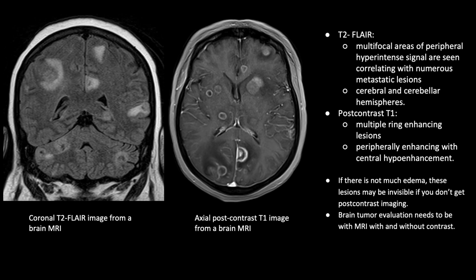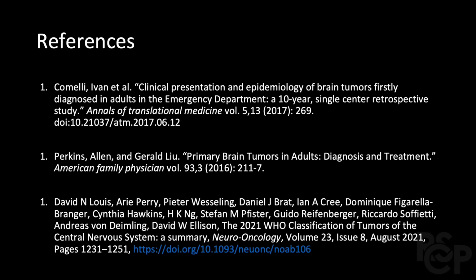On the post-contrast T1, you can see the ring-enhancing lesions, which show peripheral enhancement with that central hypo-enhancement, creating that ring-like appearance. If the metastatic lesions do not cause much edema, it can be virtually impossible to diagnose without post-contrast imaging. That's why in brain tumor evaluation, it is very important that you receive an MRI with and without contrast.